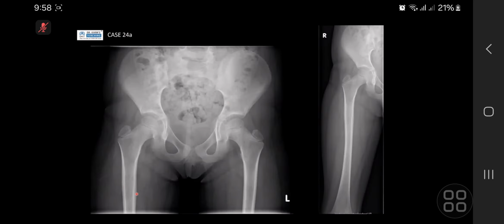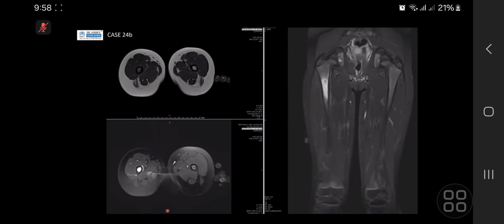So I think we mentioned the periosteal reaction here. Not much in the way of lytic or bony destruction or osteopenia. The bone densities look quite similar apart from that periosteal reaction that we can see. On MR, if I'm not wrong, these are just T2 STIR sequences, fat suppressed. There's no contrast here. On this T1, as rightly pointed out, there is an area of marrow abnormality, hypo or isointense on T1, hyperintense on T2, with probably a bit of periosteal inflammation medially. You can see a bit of soft tissue, but otherwise no soft tissue mass.